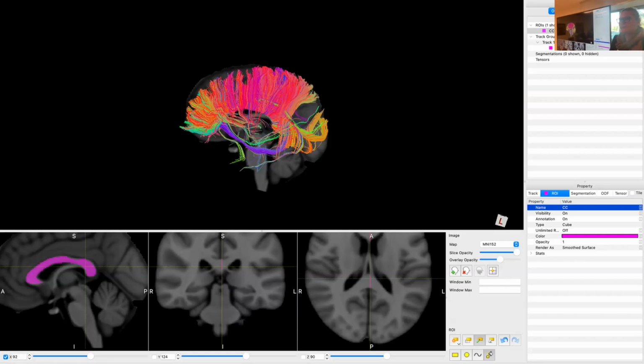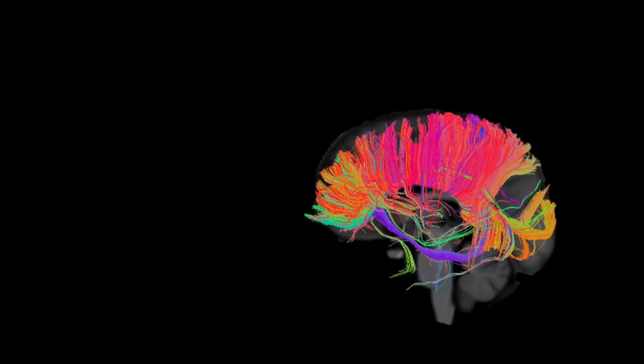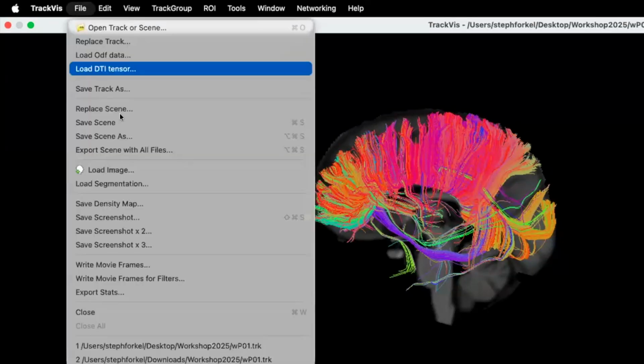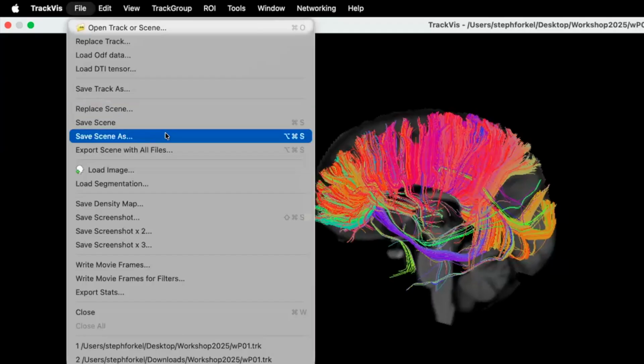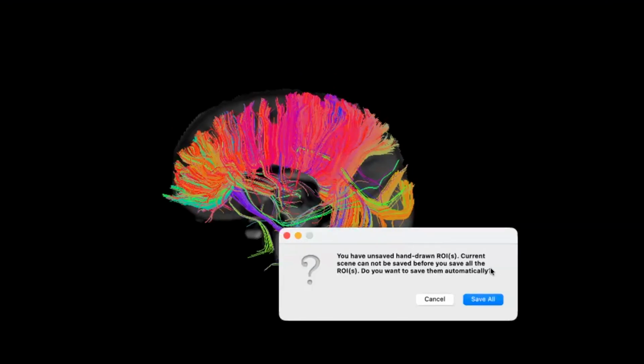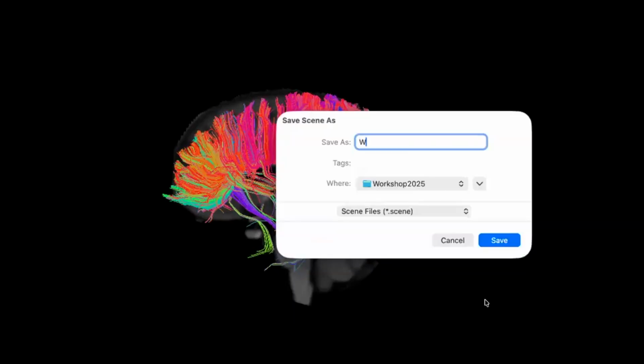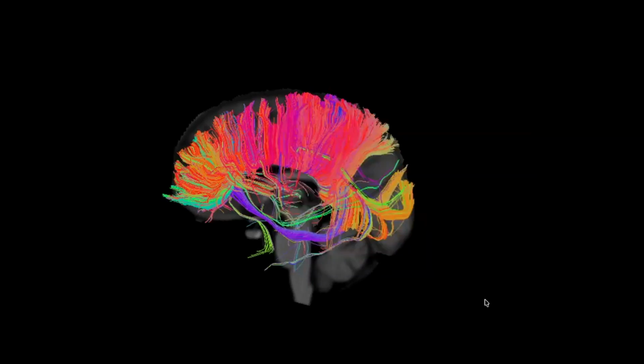Okay. Now at this point, especially if your computer is not the youngest, it's good to save everything. And you do that by going to File, Save Scene As. And then it will ask you if you're sure that you want to save it all. And yes, you are. And I'm just going to call it Workshop Bordeaux. And I saved the scene.